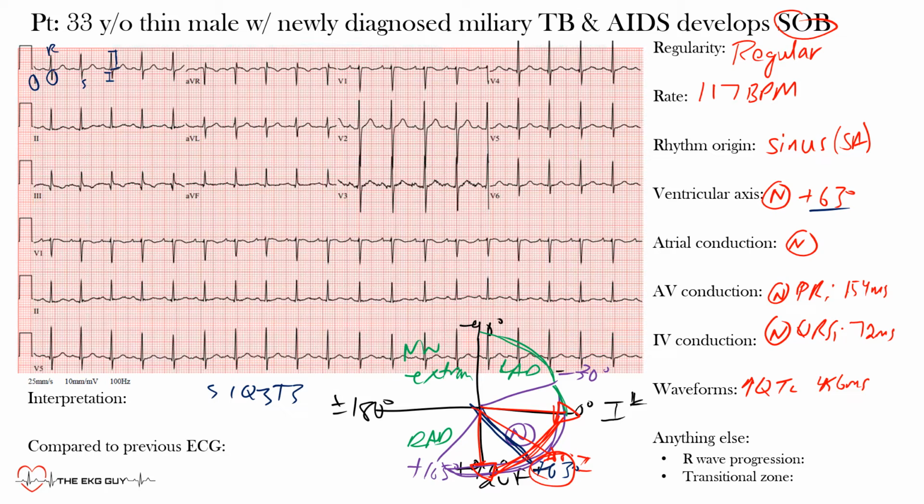And then when you look at lead 3, you can see these small Q waves developing, as well as these inverted T waves, okay? So if you look here, you can see that, that Q wave and the inverted T wave. Now, again, not specific, not very sensitive, but just a pattern that you may hear oftentimes. So, again, these S waves are not deep, that are causing the rightward shift that we would see with a right ventricular strain pattern in a big PE.